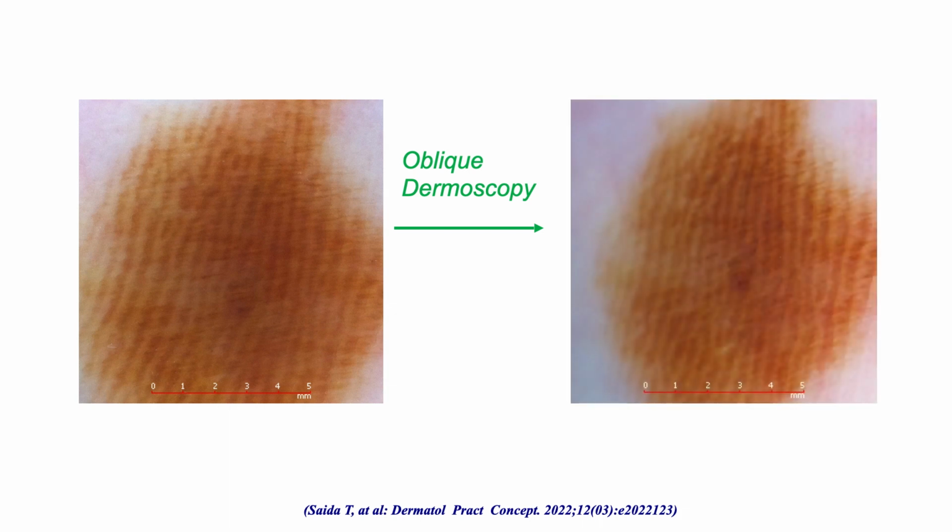The oblique dermoscopy of this lesion does not change the finding to the parallel furrow pattern. It still seems to be fibrillar pattern. Furthermore, a hint of the parallel ridge pattern can be focally detected.